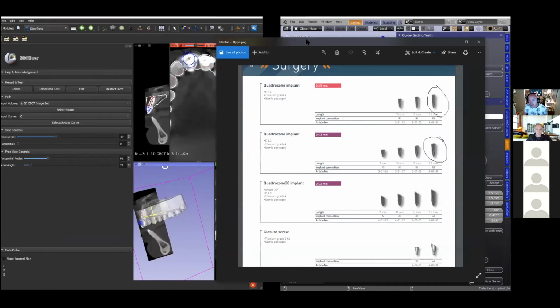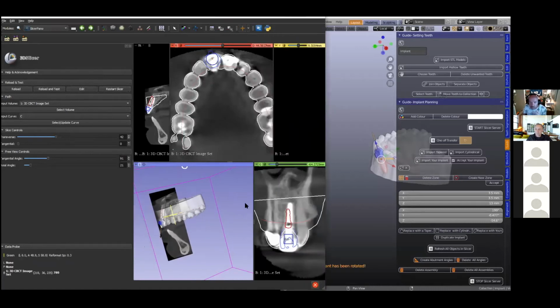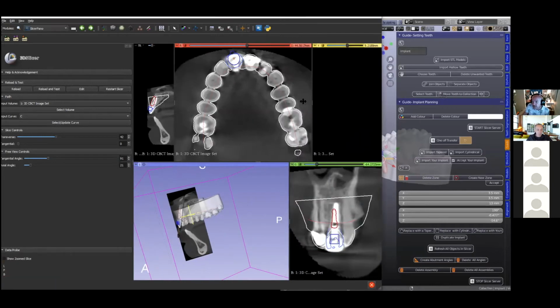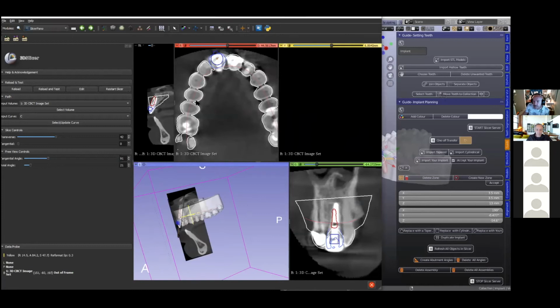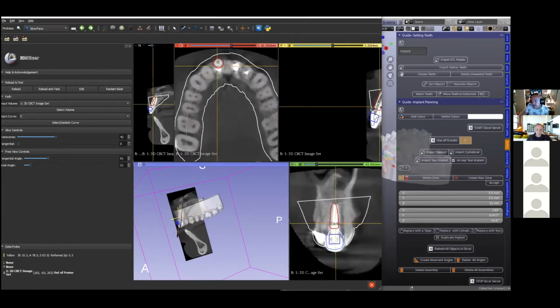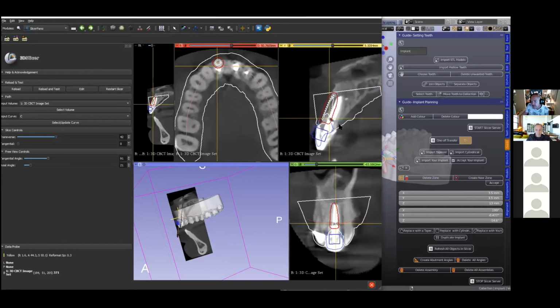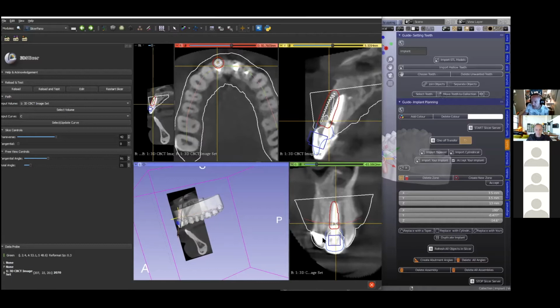This one we also don't need. All right, so if you've got two screens, it's better working on two screens. So we're going to just see where our model is here. Here we go. All right, so there you go.